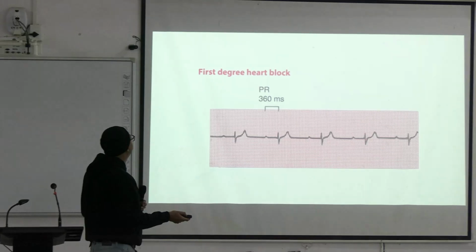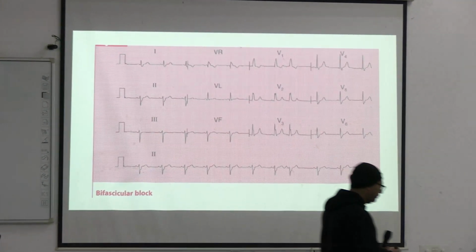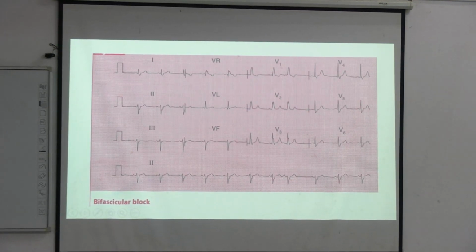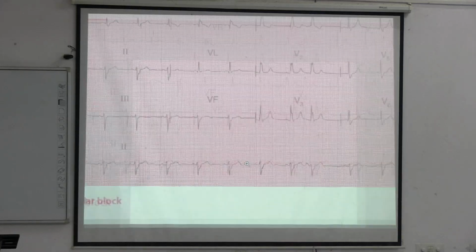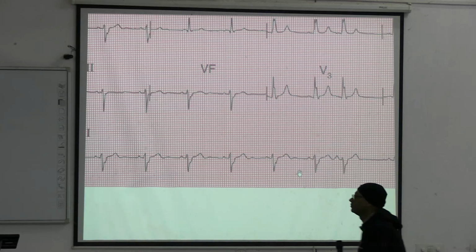So, take this example. So, here is lead 2, right? Here is lead 2.